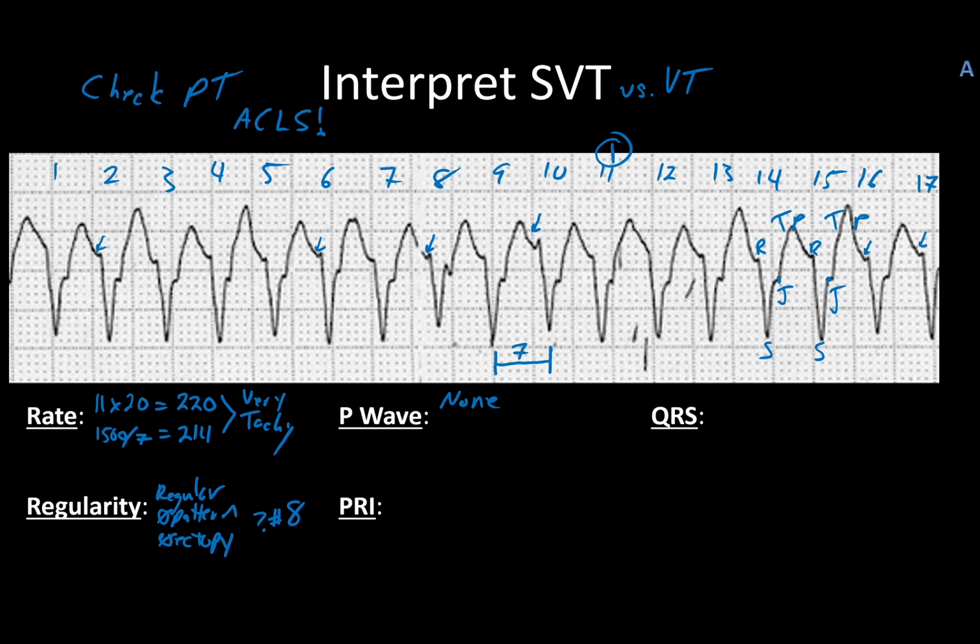So there are a few instances where, and actually you might even be able to say here, since that T wave looks a little flattened compared to the others, there's evidence that something could be going on in the background, but because of how fast this rhythm is and how large the QRS complexes are, without slowing them down or doing something different, there's no way to confirm or not. All that we can say is that there is some notching of the T waves, and leave it at that. And given this as the case, we cannot do a PRI.